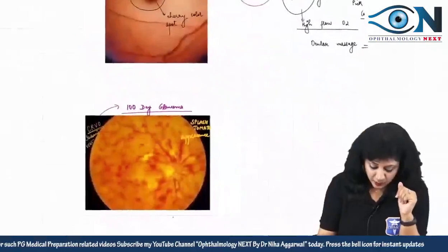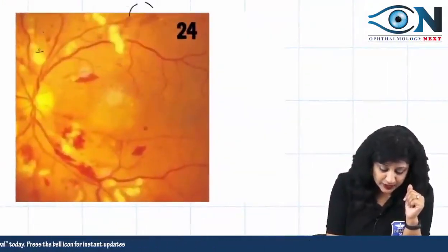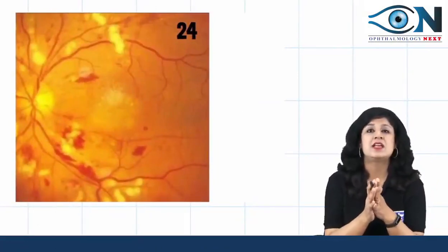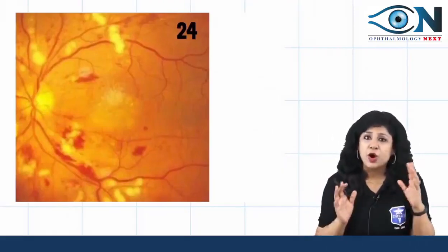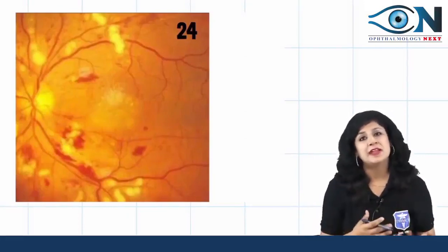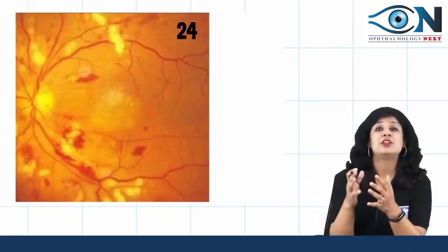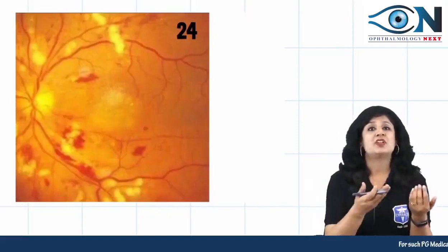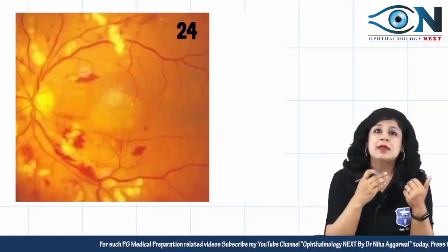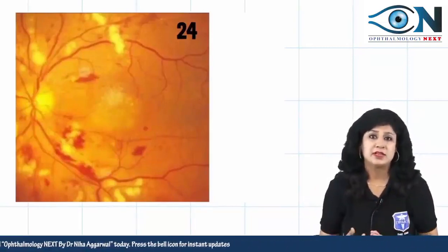All right. Now going to the next one. Coming up next are the two important retinopathies. One is hypertensive retinopathy and the other is diabetic retinopathy, and often these images are asked. So we know that in the Western world, hypertension and diabetes are increasing, and nowadays with better technologies and longevity, patients are living with these diseases for a long time. And because people are living with these diseases for a long time, they are developing the retinopathies.